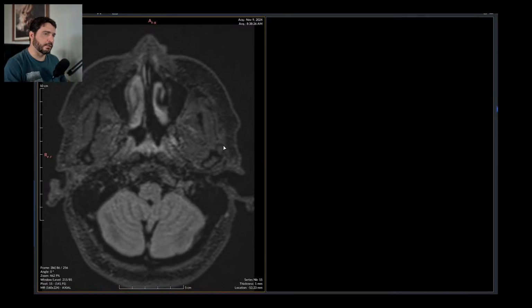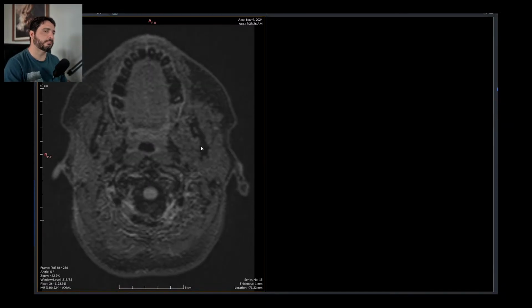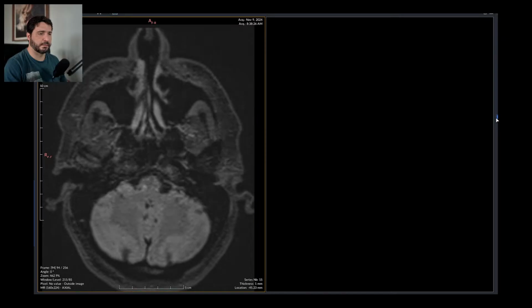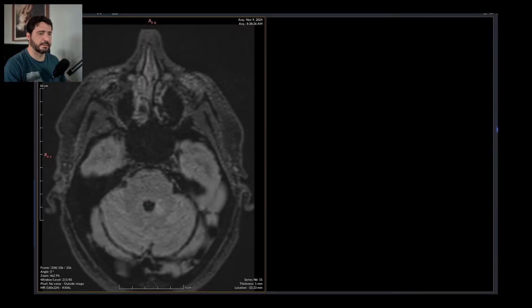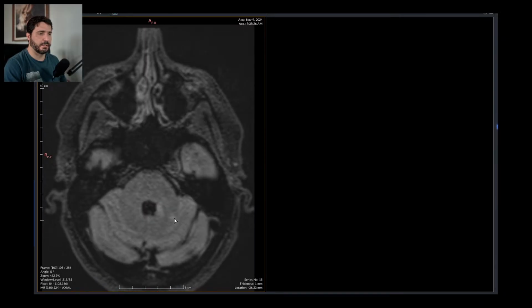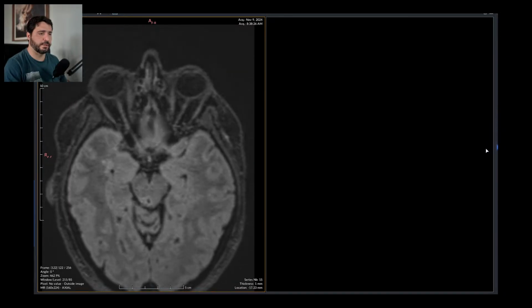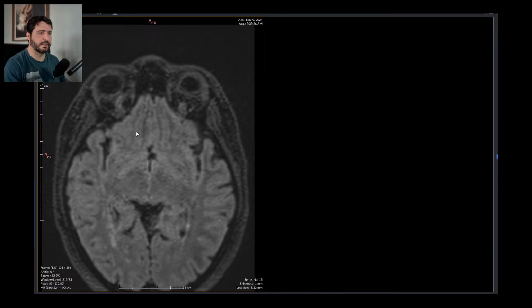This is a noisy scanner because there is way too much noise on such a sequence. So this hides tiny spots of disease behind massive noise. See how noisy this is? How noisy the air around the patient is.